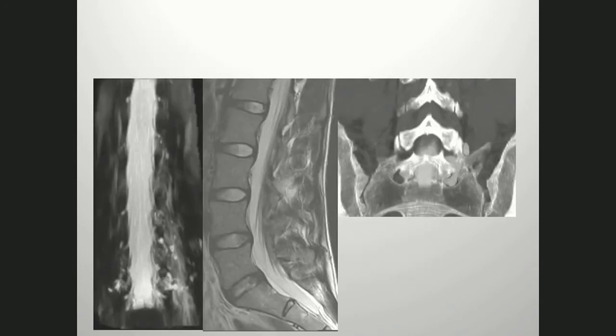Sorry, let's see. This is a young lady from the East Coast. She came over. She had, similar to the earlier case I showed, large areas of CSF seepage in the T2 myelogram, but also a largish cyst at the L4, L5, L5-S1 level, which was very nicely shown on the CT myelogram. And she underwent successful fibrin glue, which we talk about later.